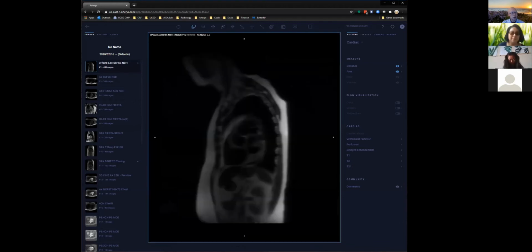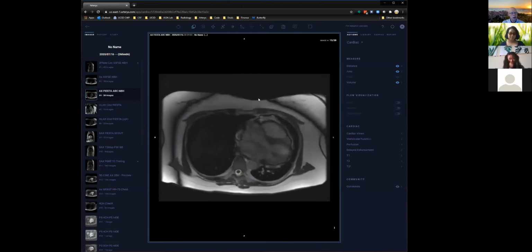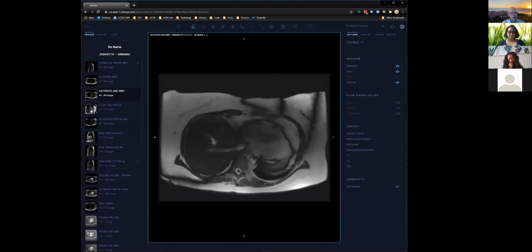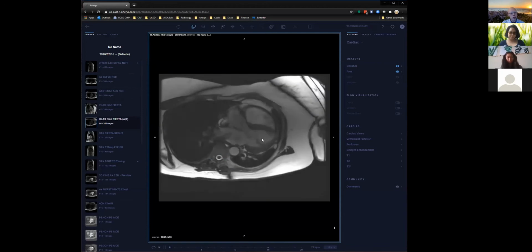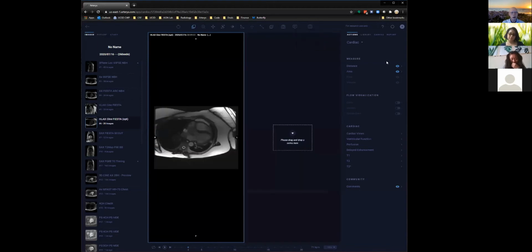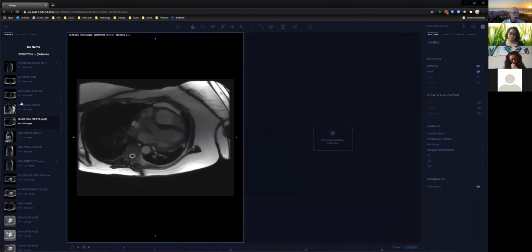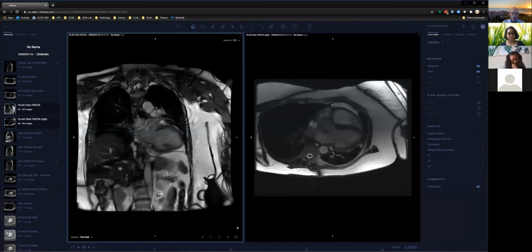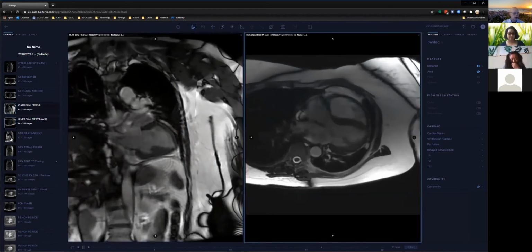Single shot black blood axial, and axial Fiesta or SSFP, and then a gated. So these are actually non-breathhold, and then here's our first breathhold. Here's a long axis in the horizontal plane. There's some flexibility for viewing here. I'll just increase my window size here so that you can see. It's a pretty good viewer now for most of our standard imaging.